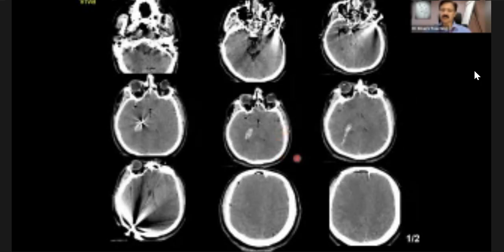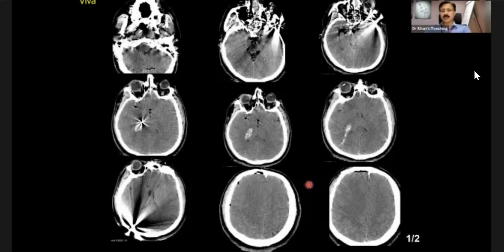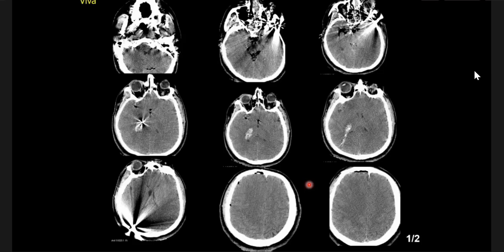Okay, candidate 7. What is this? So it looks like the patient has had previous embolization clips, and then around that there is acute hemorrhage with areas of pneumocephalus. Hint: A and E. Patient is very serious, in coma. I can see a lot of pneumocephalus throughout, and then there is significant brain edema with complete effacement of the overlying sulci and some midline shift to the left and acute hemorrhage.